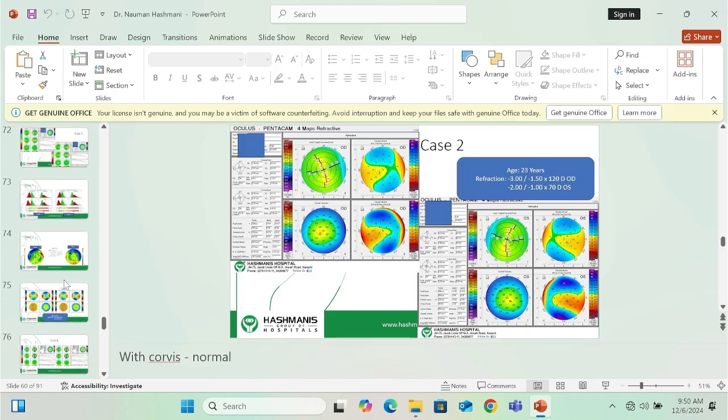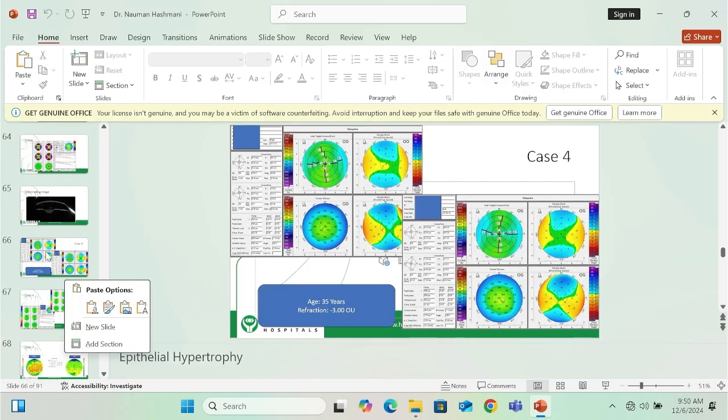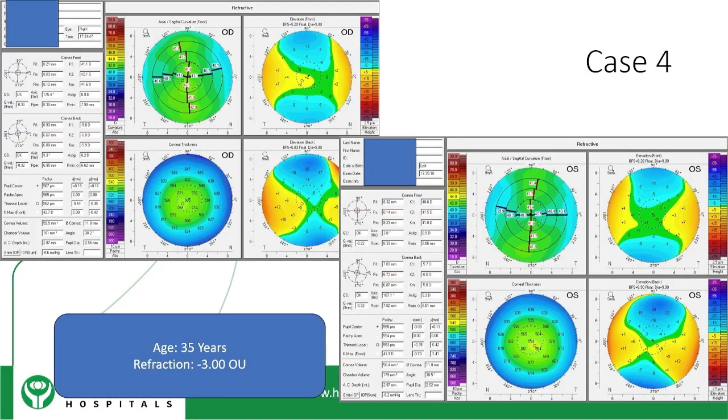Yeah, so the reliability that he's talking about is actually given by the quality specification value. That's the Q value that you see here, the QS. If it says it's okay, then it's usually okay. But again, QS is not always reliable.